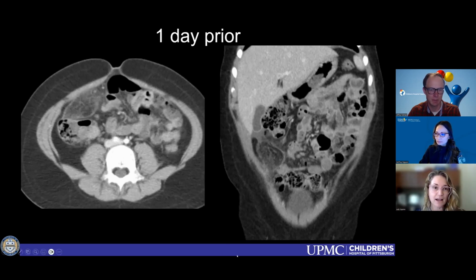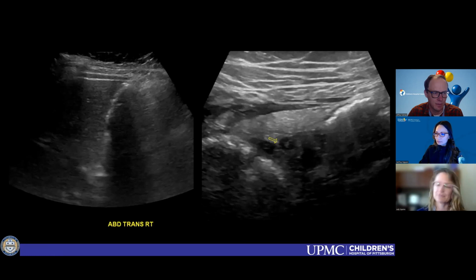One other interesting thing: on the CT, the appendix was retrocecal, and on our ultrasound, it was not. I guess that makes you even more confident that it's a normal appendix, that it moves location. But I was very surprised we actually saw it after I saw the CT.